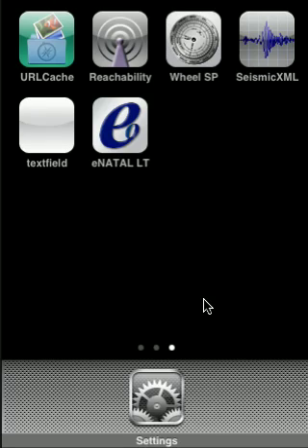Okay, thanks for taking a look at eNATAL LT. This demonstration will show you the features, although I don't think they're that hard to figure out.